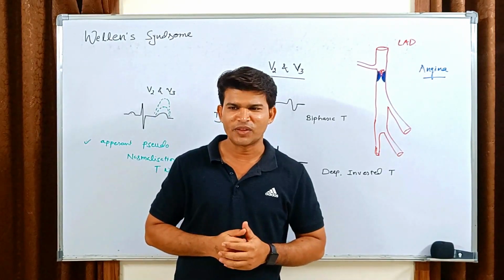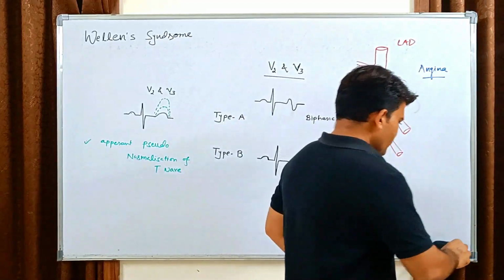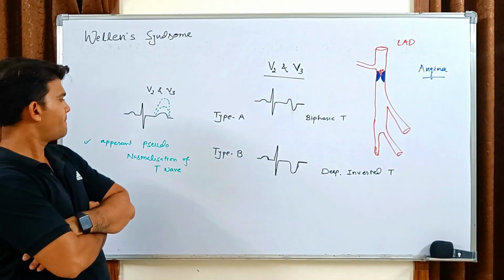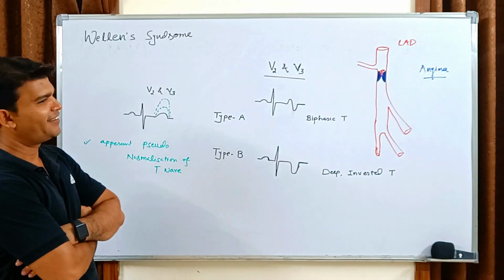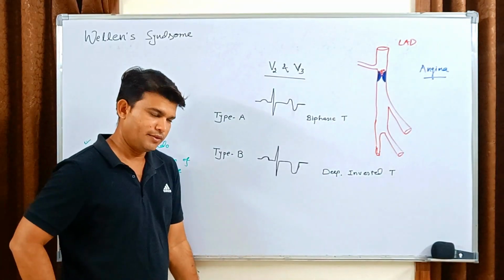Let's have an ECG study. Like what we discussed last, an apparently normal-looking ECG you can still not call normal. Normal, exactly.